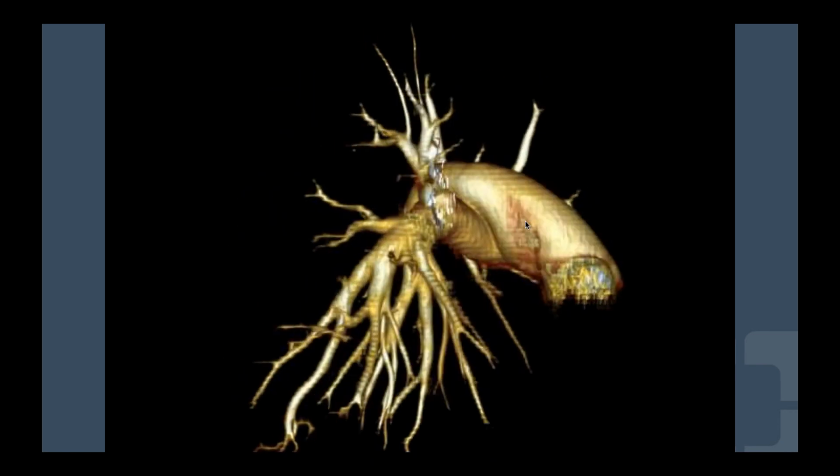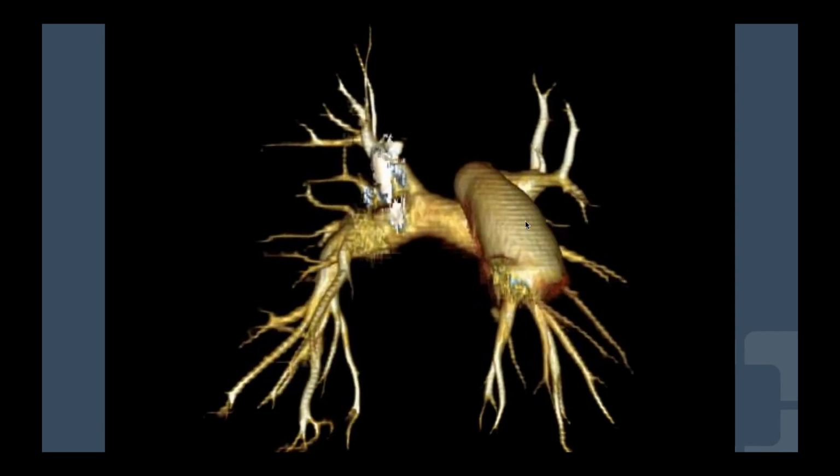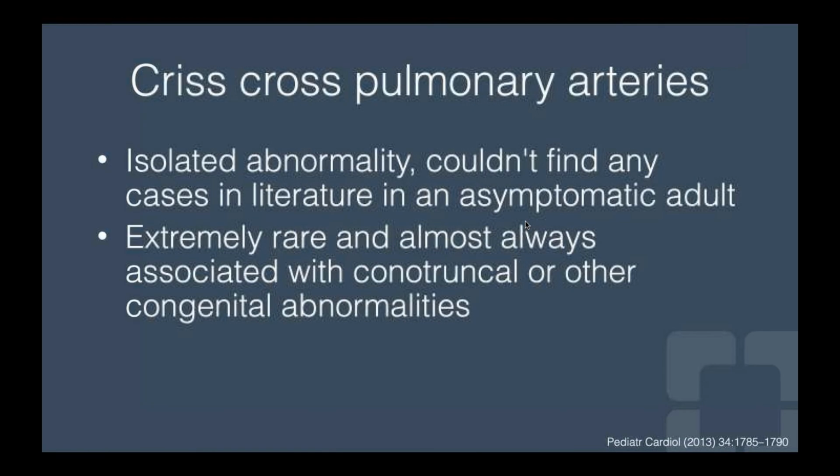Okay, just going to let this scroll back and forth. So even though you may be scrolling a bit more jumpy on your screen, if we let it go enough times, you may get an idea. Any comments? Anything that looks weird?